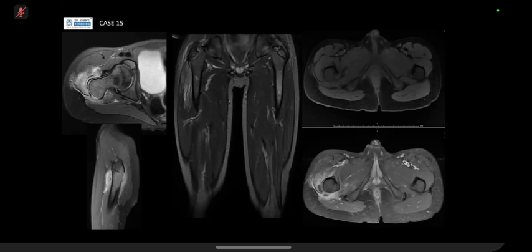And on post-contrast, there is an enhancing well-defined collection seen, 2 collections. Can I have a clinical history of the patient, please? Right leg pain. Does he have fever or anything? Yeah, he's got a fever. ESR elevated. CRP is 70, white cell count 25.